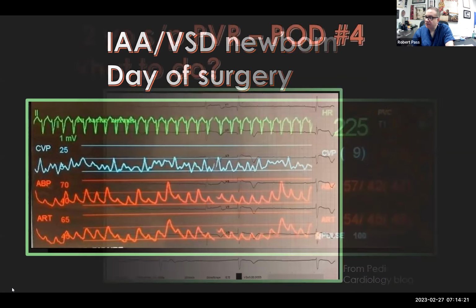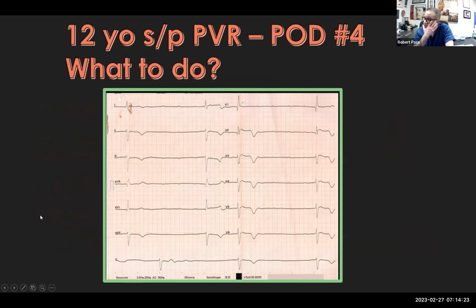Okay. All right. So this is a 12-year-old following a pulmonary valve replacement, and we're postoperative day 4. So the question is, what are we looking at, and what should we do about this? I'm going to ask Dr. Candon what she thinks.